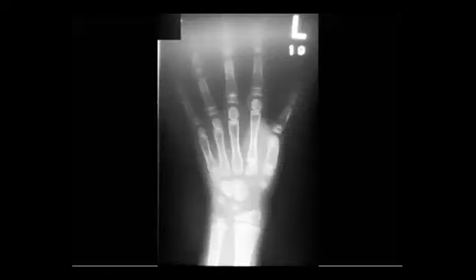Multiple Wormian bones, bossing again. And here the hand, you have two hands tonight: trident hand of achondroplasia and claw hand of mucopolysaccharidosis. And here, what do you have here, how do we describe it?